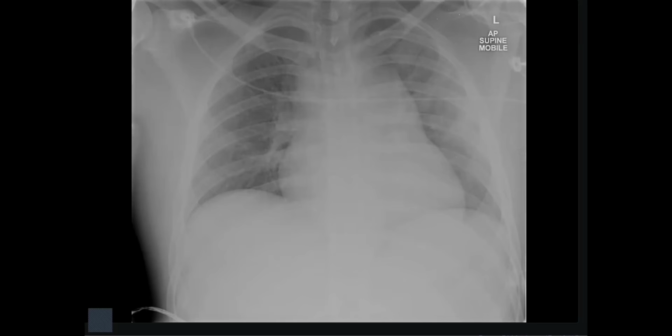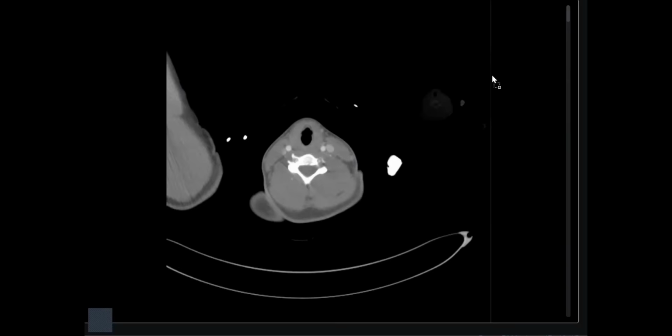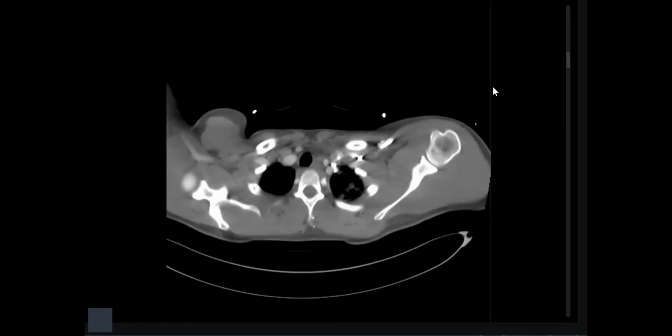Okay. I'll give you this case. Can you ask for the control? Yes, sir, I have requested. Okay. So just one click, then you can scroll. Yeah, it's coming.